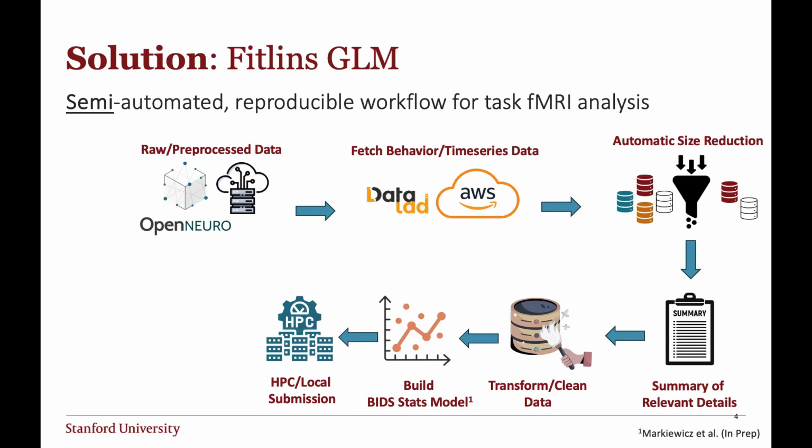When you run this, we wanted to offer both a local option, so you can facilitate the run on your machine. But given the growing demand and use of high performance compute, we also created bash scripts, so you can submit Slurm jobs very easily by quickly modifying the file, so things go a lot quicker. This reduces compute time from, say, days on your machine to, I think sometimes I've been able to run things in like 2 hours.